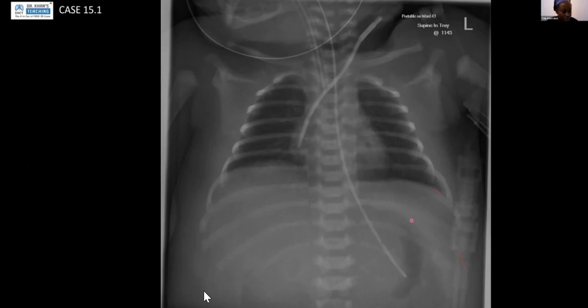As candidate 3 said, there is this rounded lucency over the visualized abdomen. What this radiograph is basically showing you, if you ever get presented it in an exam, is that initially you think it's a chest radiograph, I need to focus on the chest. But don't forget to look outside of the chest and at the periphery of the film, because the abnormality might actually be there. This is actually a football sign, which is incompletely imaged because we don't have the whole abdomen on, but this is seen in pneumoperitoneum.